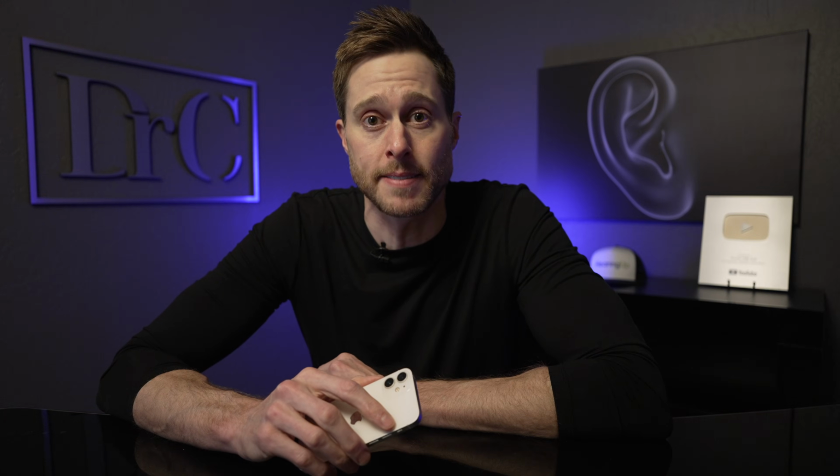That's why I'm going to walk you through the basics of the MyStarkey app to help you avoid confusion so you can start getting the most out of your Starkey hearing aids. And I also have a bonus section at the end of this video with hidden features that you cannot find inside of the app.